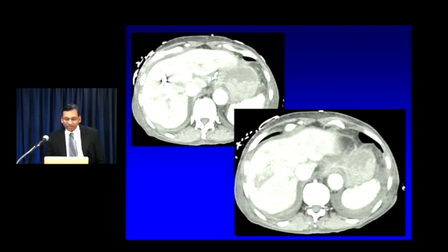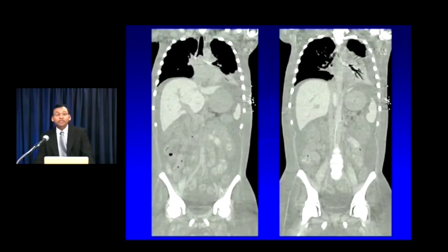Now here's an example where it actually does help you quite a bit. I don't see active extravasation. Unfortunately, we're kind of limited by the fact that this is just a venous phase, but notice that there is high density clot layering within the stomach. This was a gastric bleed that was actually confirmed at endoscopy. And sometimes you can use the sentinel clot sign even in cases where you haven't given IV contrast. This is a patient who has horrible GVHD. The bowel looks incredibly thickened. The patient's really sick. They had lower GI bleeding.